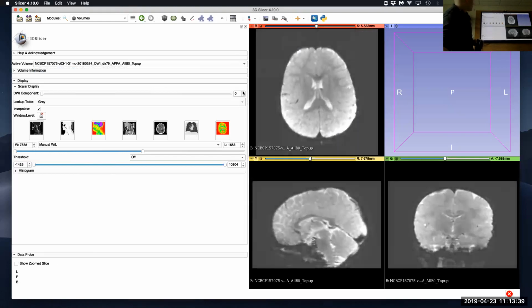And what you'll see, it's not perfect. It's a third order approximation. So here's the change again. It's not perfect. You can still see that this one is more elongated, and this one is a little bit more compressed, but it's much, much better than it used to be.